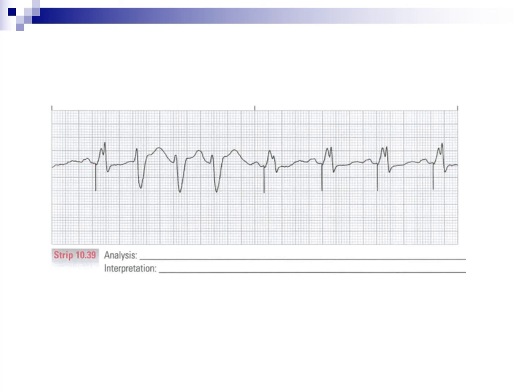So it is capturing when the pacer spike comes. It's sensing when the patient is having their own beat. The distance is the same as if you were to do pacer spike to pacer spike, so it is measuring the correct distance. So it fired when it was supposed to. It's sensing appropriately, so it knows when it's supposed to kick in. And it's capturing, so every paced beat has a captured beat. And this is a normal functioning pacemaker.